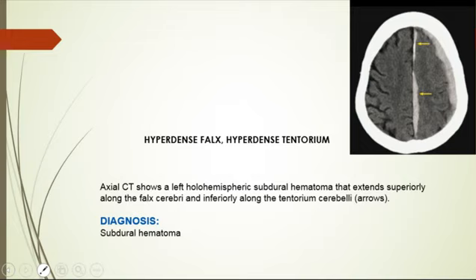In the very young and the elderly, also in alcoholic patients, the presence of enlarged subdural space can predispose to subdural hemorrhage with minimal head trauma. Symptoms include gradually increasing headache, confusion. At imaging, the subdural hemorrhage is typically crescentic in appearance, outlining the cerebral convexity and tracking along the dural reflections, the falx cerebri and tentorium cerebelli. A small subdural hemorrhage may represent as a subtle hyperdense thickening of the falx or tentorium, which can be easily missed. So you need to be careful here.